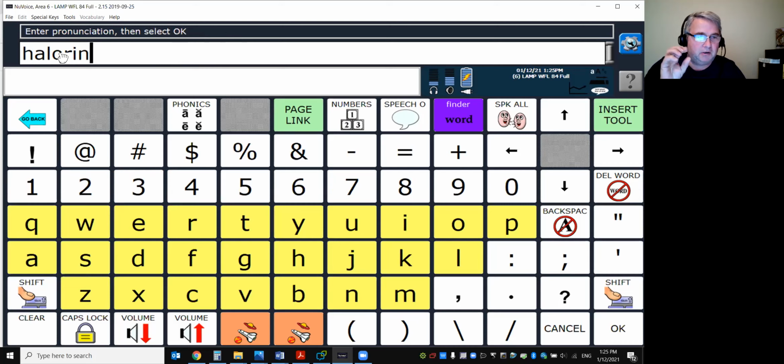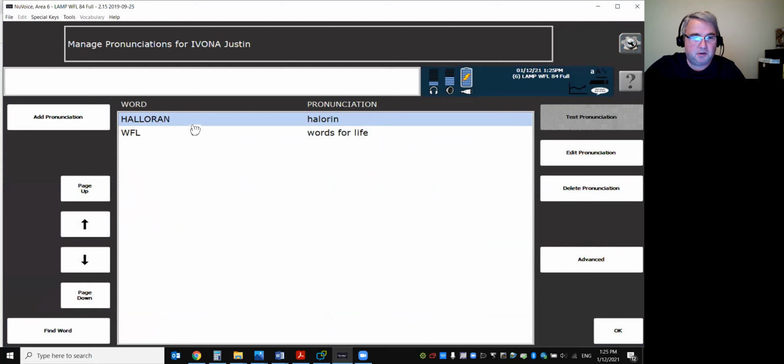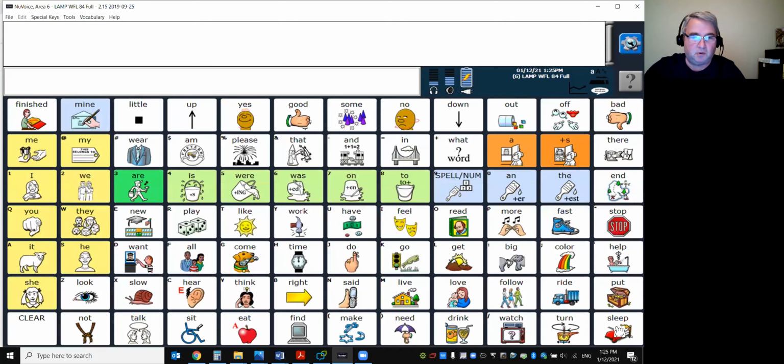And when you do that, you'll hear it on your device, and you'll be able to say, yeah, that sounds good. And if it doesn't, you can keep playing. Once it's perfect, you hit OK down here in the corner, and then you'll see it shows up, Halloran, pronounced as this. And from that day forward, if anyone spells it or has it stored in their device, it will sound right and look right.